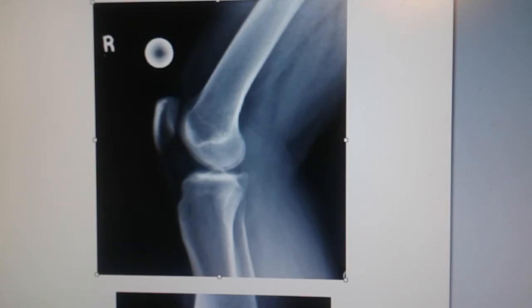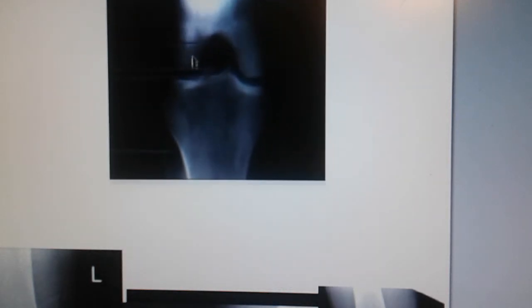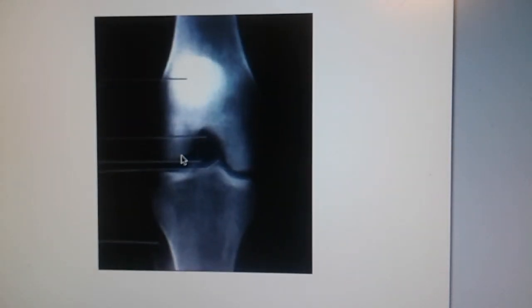So we'll move on to the next projection, which is an AP axial projection of the intercondylar fossa. In my trigger, I did the Camp Coventry method, which, if I remember from notes from class, makes the whole thing look a lot more elongated than this one, but this is what I found. Couldn't find one without any anatomy on it, so don't look at that.